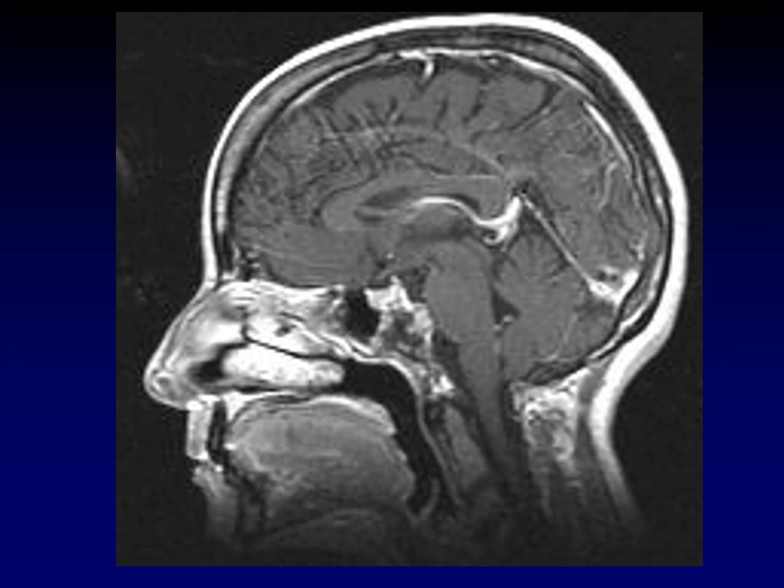Here's another example where a mass can secondarily involve the sixth cranial nerve in Dorello's canal. Here we see a lobulated mass centered in the clivus. This is a bony lesion, but we know that Dorello's canal is running right up the back of the clivus, so it's not surprising that as this lesion expands, it might compromise the sixth cranial nerve. This happens to be a chordoma of the clivus.